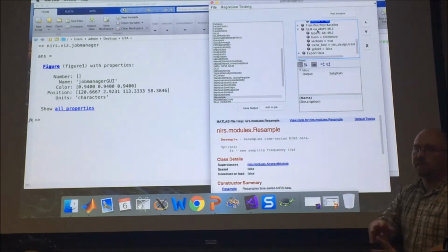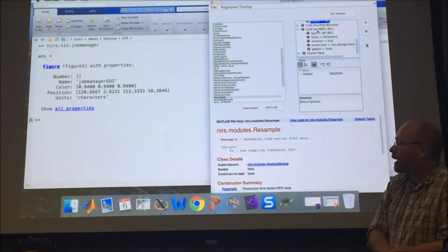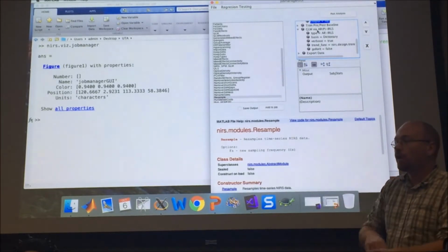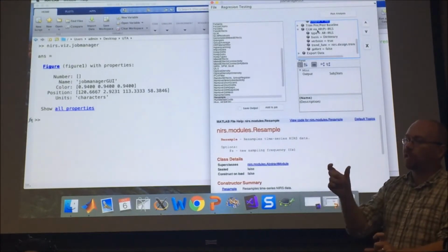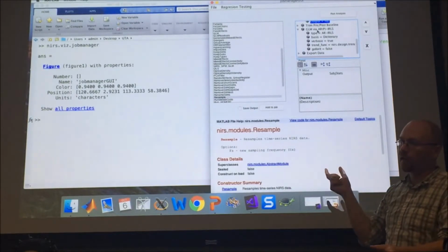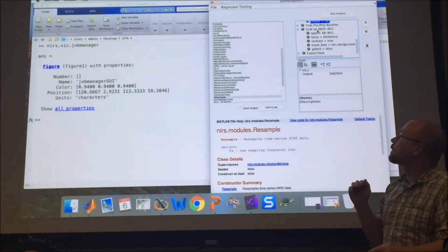So the default is this canonical HRF taken from the AFNI fMRI parameters. But there are other options for gamma functions, for FIR, where you're actually estimating the whole curve. You can use a different basis set for oxy versus deoxy, or for condition, in this case right hand versus left hand, where you can impose different shapes if you had reason to believe that they were different.